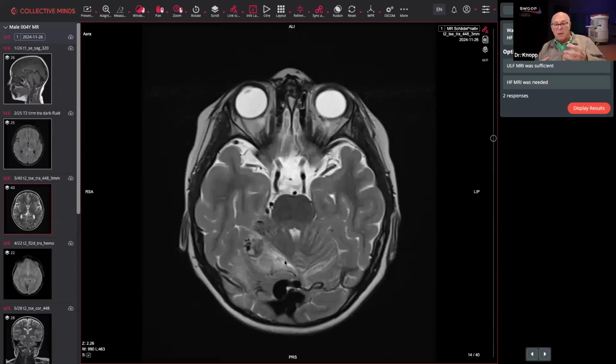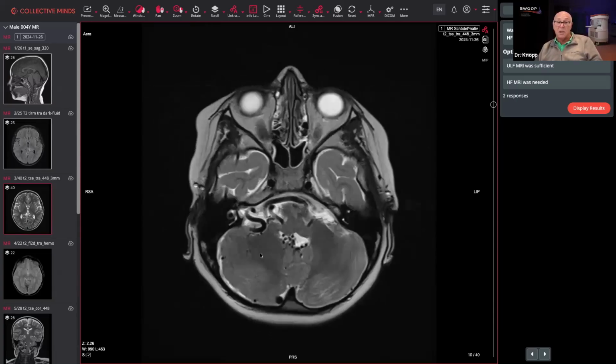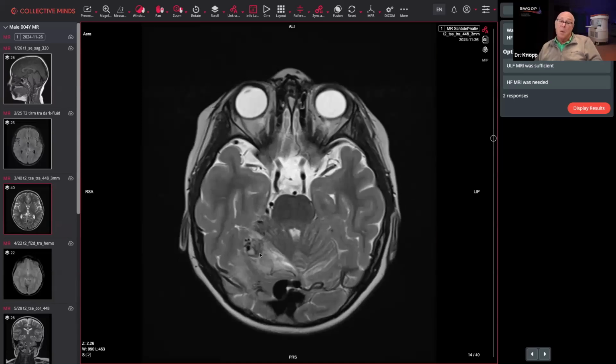But in addition, we see all of this black. And on T2, we know that these areas are signal voids due to flow voids due to increased flow. And the location of some of these is consistent with large arterial venous structures, or arterial structures, as well as prominent draining veins with kind of more punctate centrally. The hallmarks of arterial venous malformation. You need an enlarged artery, you need draining veins, and you need something malformed within the lesion itself.